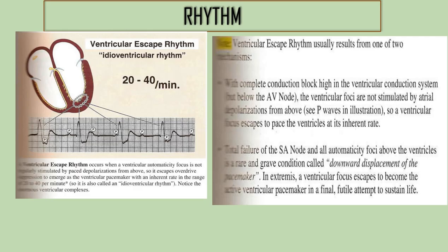Total failure of the SA node and all automaticity foci above the ventricle is a rare and grave condition called downward displacement of the pacemaker. In extremis, the ventricular focus escapes to become the active ventricular pacemaker in a final futile attempt to sustain life.